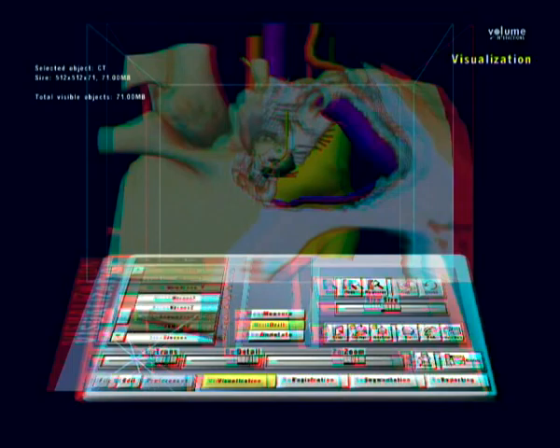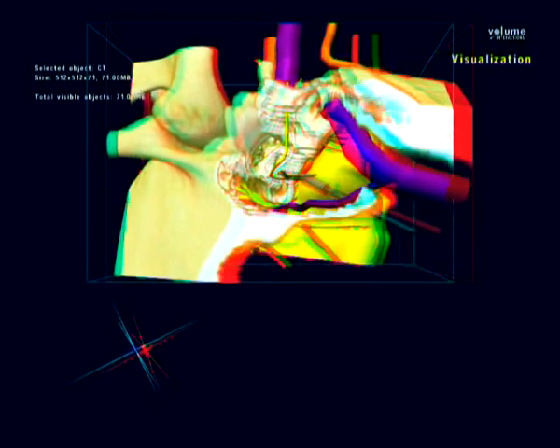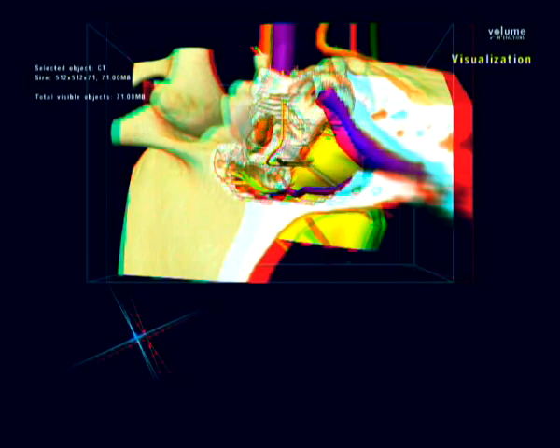the tympanic membrane removed, and the cochlea removed. The facial nerve is now completely skeletonized and exposed. In a classic transcochlear approach, the facial nerve is transposed, but we have left it intact in its original location here. The petrous bone is now drilled very anteriorly to expose the internal carotid artery in its vertical portion.